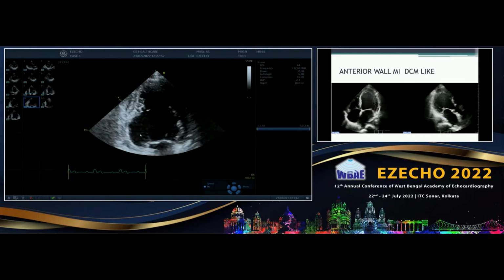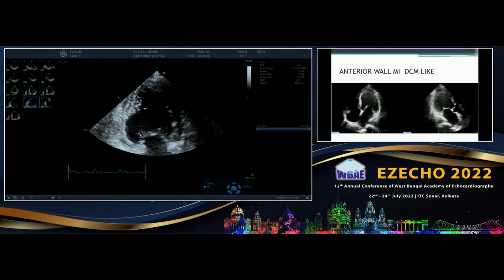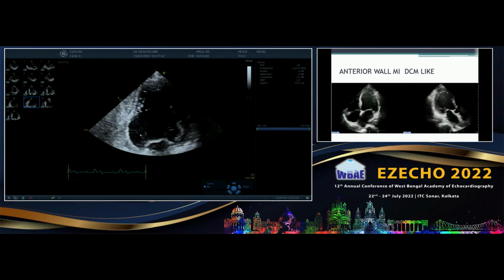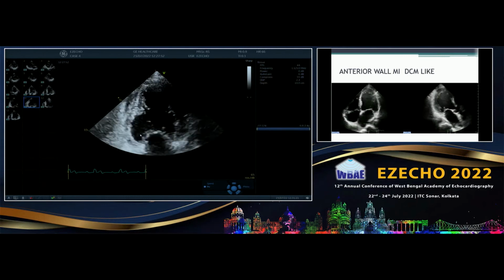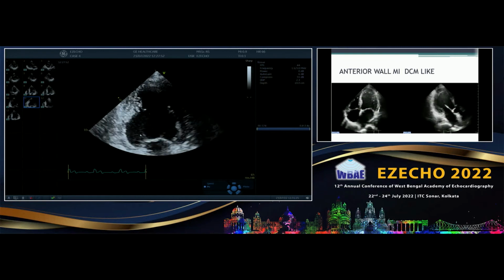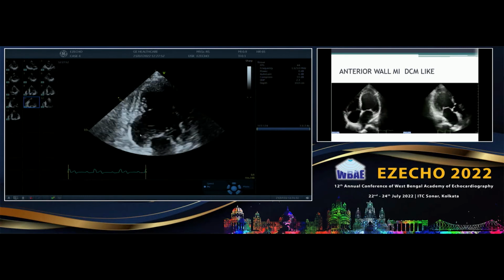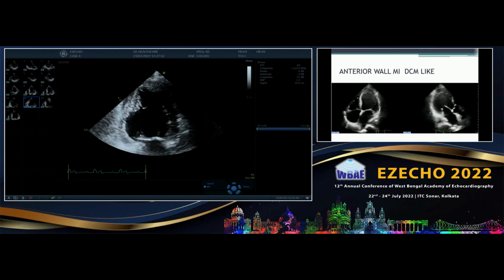Whether I go in short axis ahead, it is tapering. In long axis, if I go on either side, it is tapering. So if the heart moves through the imaging plane, you will have that feeling that the endocardium is coming closer. And you may feel that this is contracting, but it is not contracting. That is a translational motion. So tethering and translational motions are important to look at. And as I told you, now we know that this is the area.